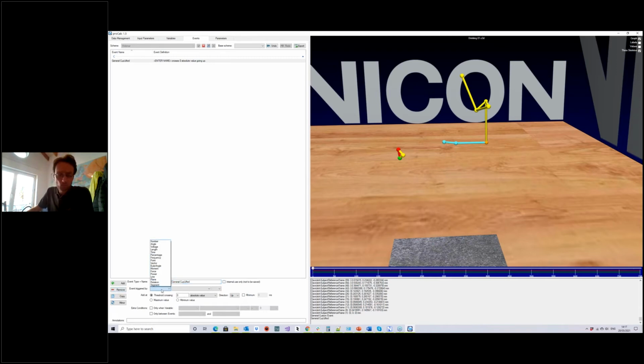So what do I want to trigger this by? Well, in this case, I'll actually trigger it by the cup velocity magnitude.